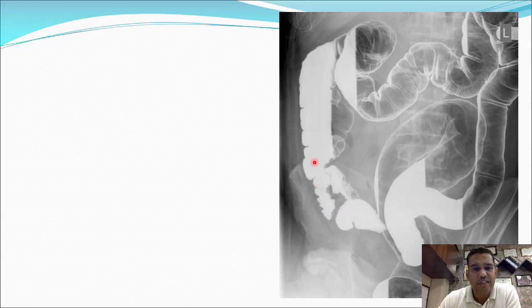I am able to appreciate the bowel on the lateral wall of the right side. This appears to be the transverse colon, and you could appreciate the descending colon, and this is the sigmoid. So this is a contrast X-ray visualizing the colon. You would appreciate these are called the haustrations. These are incomplete. They never cross the full wall from here to here. They end up somewhere here. So this is not complete.